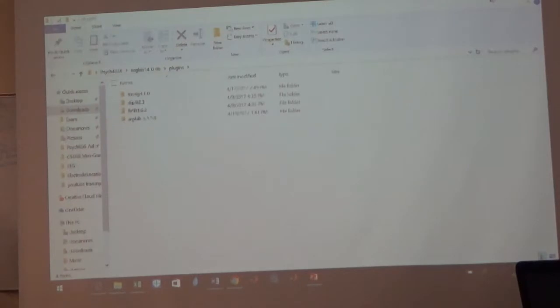Yeah, you did. You have 1, 2, 3. Yeah, something's wrong here. We should talk about that in class. Okay, that's okay. We'll look at this thing. No, valid.